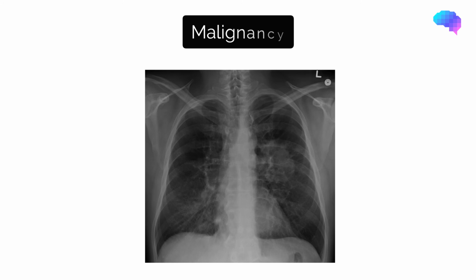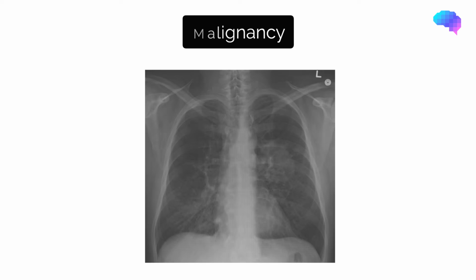In this film, there is an area of rounded consolidation in the left lobe with a clear border. In this example, this is likely to indicate an underlying malignancy.